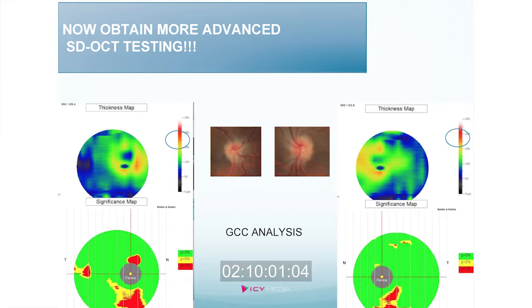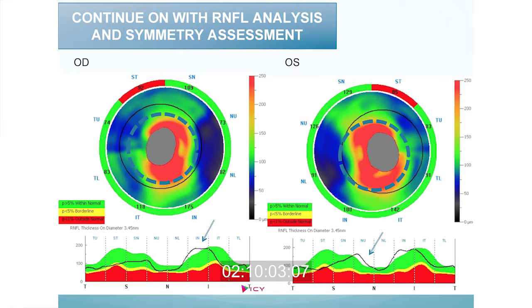of the situation. Okay. Here we look at the RNFL map, which we talked about before. The ring around the outside shows us the statistical significance. Most of it's green. Again, elevated tissue. It's falling in the norms there. It's saying, oh, this patient's got a lot of tissue. Okay. And then you look on the inside to look at the thickness of the different sections. And remember, we want to see the red color superior and inferior.